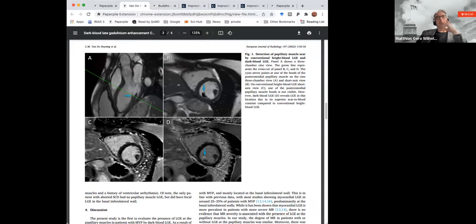We also in our group have the feeling that the structure of the papillary muscle apparatus is somewhat linked to the overall structure of the left ventricle, sometimes associated with a little bit more trabecular tissue or relatively increased trabeculation. And then you see in the standard LGE images, this is what you could easily overlook.